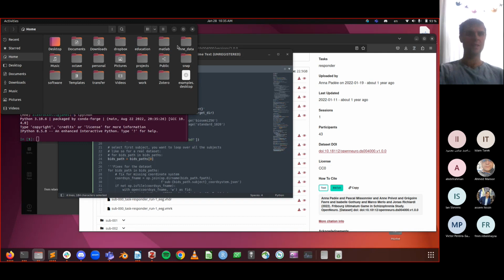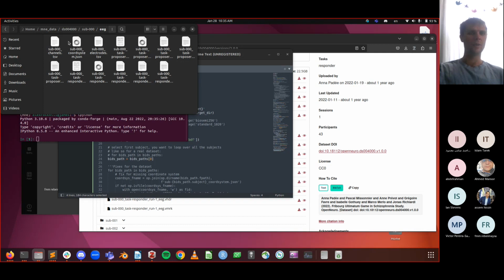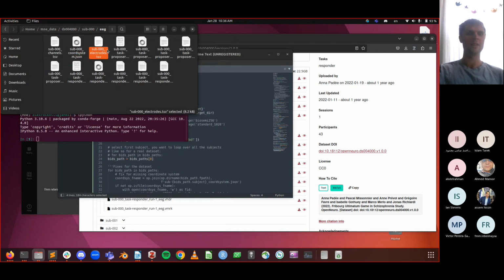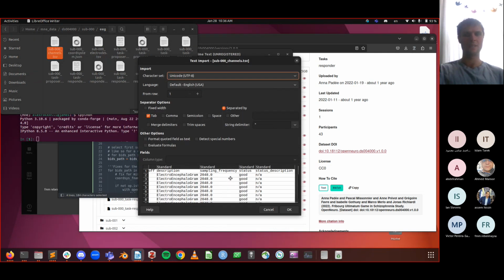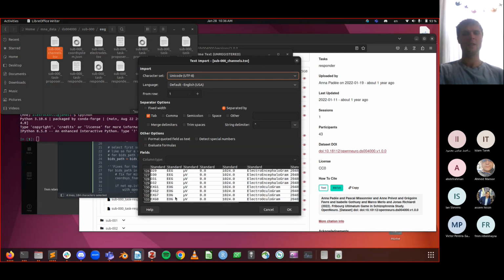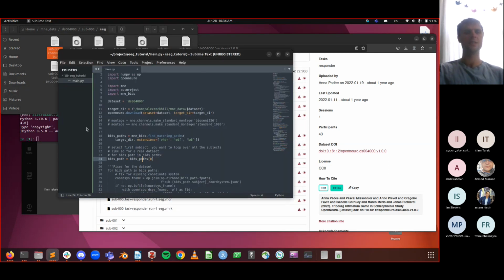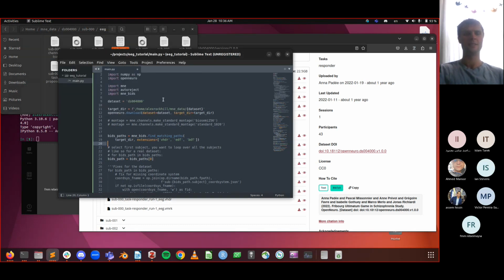channels.tsv or this events.tsv. So in this subject 0, you have a coordinate system.json, which is going to tell you that it's in CapTrak with meters as units, and you have the electrodes that they included. But then you can also have a channels file, which is helpful because it tells you that the status is good and that they're EOG channels at the bottom. Since they didn't include those, it doesn't work automatically with these automated tools to read in BIDS. So it's really helpful to have all these things.